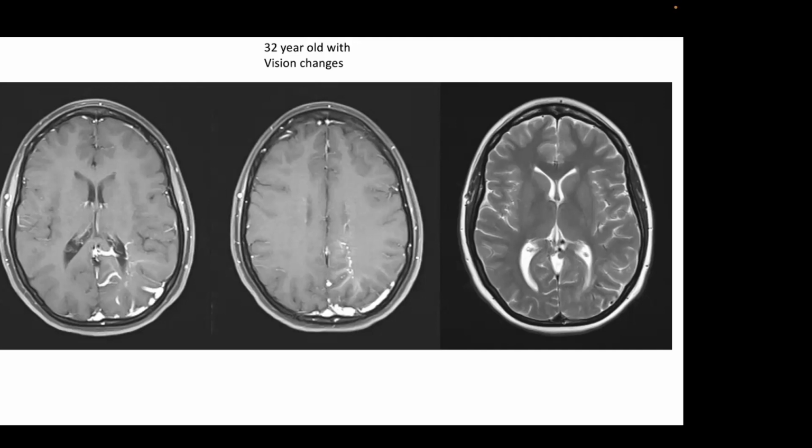And remember we talked earlier about how sometimes it's difficult to distinguish AVMs from what other benign vascular condition? Developmental venous anomaly, DVA. Yeah. So I wanted to show you this case. These are what I call telephone diagnoses, where you do better in some cases if you write down the findings than if you actually look at the images. The reason I say that is, let's say I'm a resident on call in the hospital, and I call my attending up and I say, I have this unusual case here.